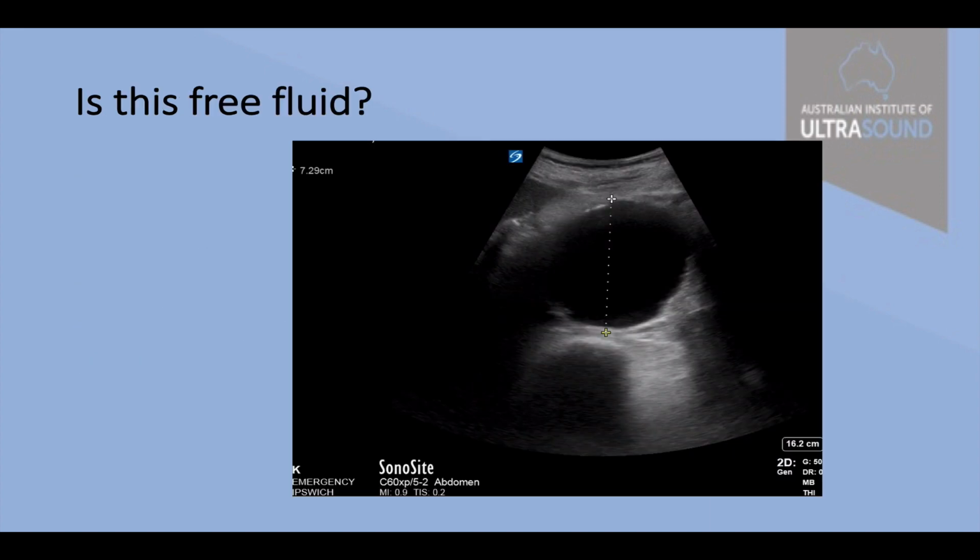So, the next thing we have to do is look at a pile of slides and get your eye calibrated to think to yourself, is it fluid? And then secondly, is it free fluid? It's much harder with a still picture, but going by the shape of this it is most likely to be bounded fluid. Fluid encapsulated often has some sort of visible capsule that you'll see at least at the leading edges rather than the sides. This, by the way, is an aortic aneurysm.